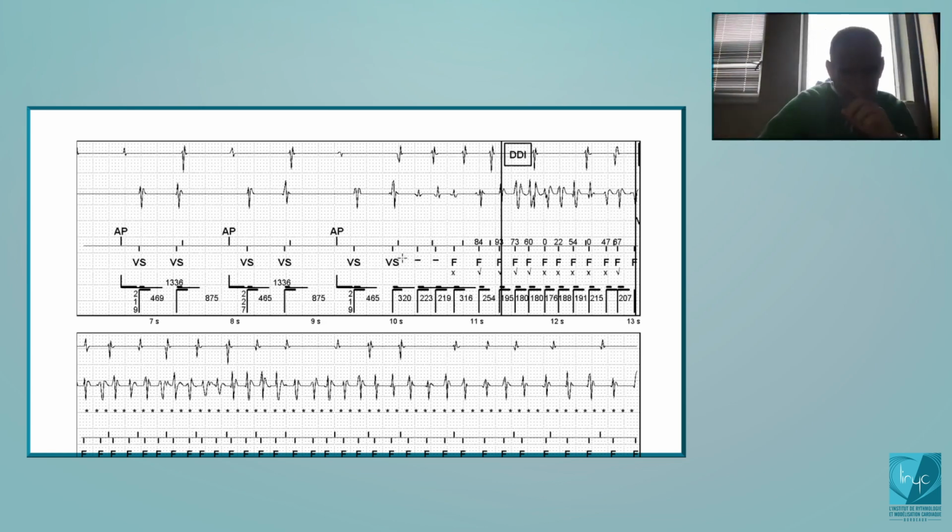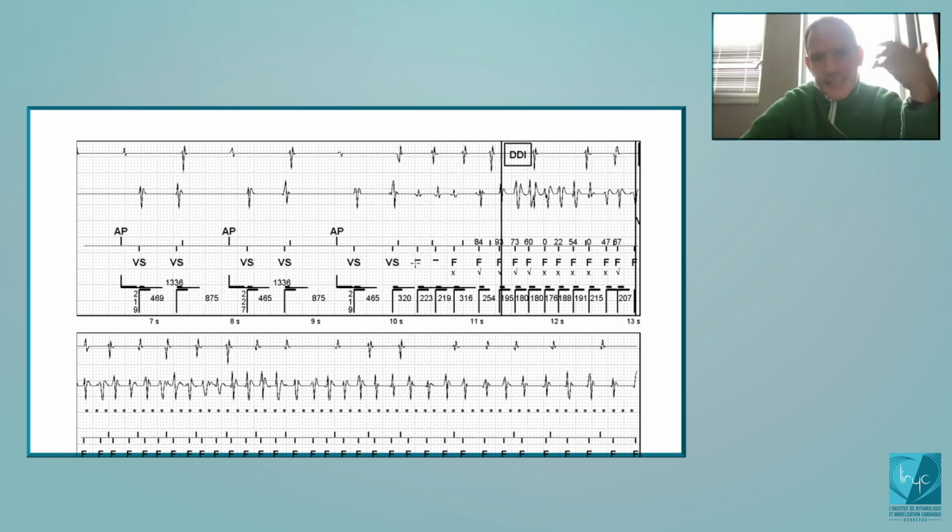So to be clear, this cycle corresponds to the VF zone, but the average value of the last four cycles still corresponds to the slow zone, to VS. So since there is a discordance between the current interval and the average value of the last four, the signal is classified as in transition, or you can say non-classified.